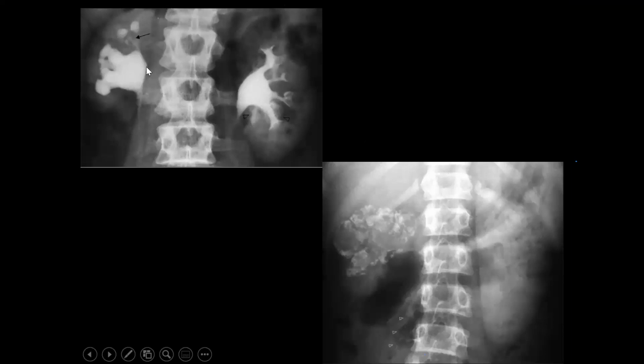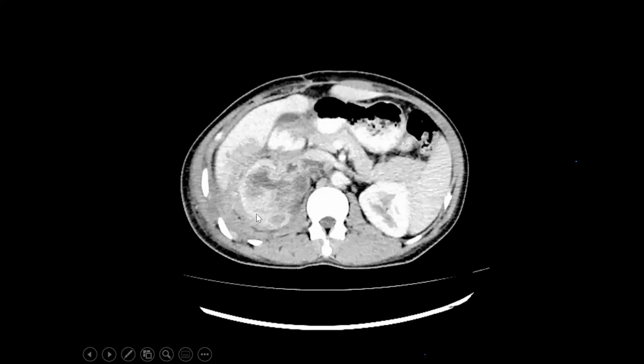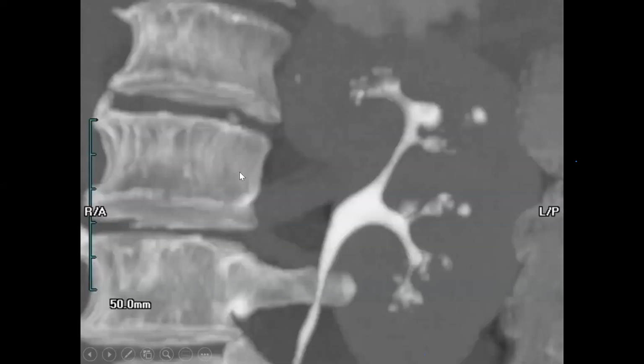How to diagnose tuberculosis? In late stage, end stage kidney disease, it is a putty kidney, which is small, shrunken and calcific as seen here. But in an early phase, it can be seen as infundibular stricture with focal caliectasis or calyceal dilatation, which is cut off from the rest of the kidney, and can progress to renal parenchymal cavitation. That should make you suspect tuberculosis. So this is another example of a tubercular kidney with focal parenchymal cavitation, and the inflammatory changes are extending outside, gradually even involving the hepatic surface.